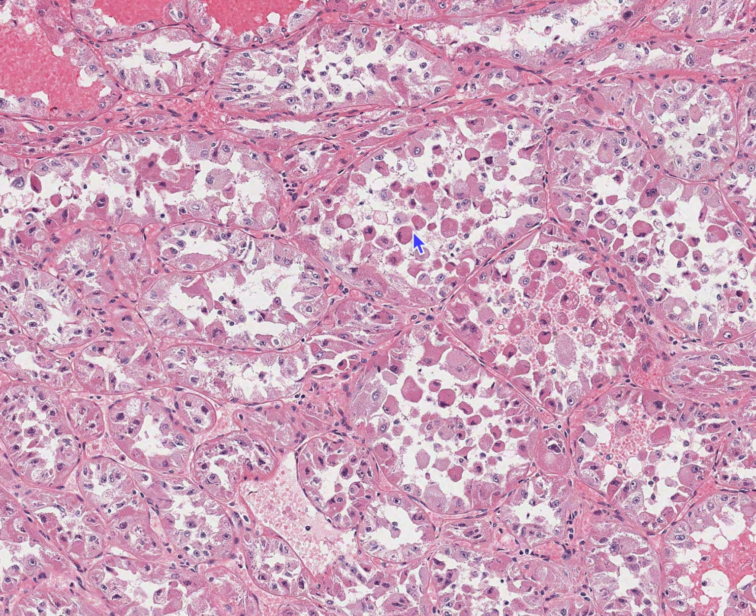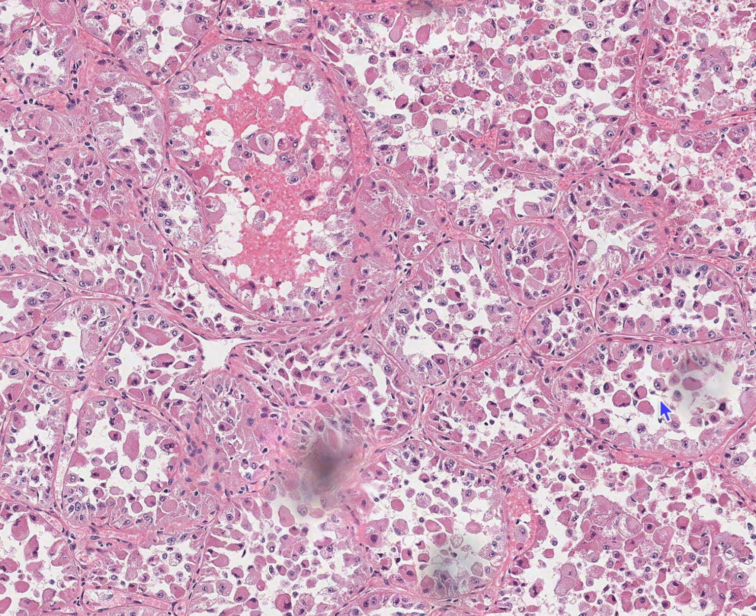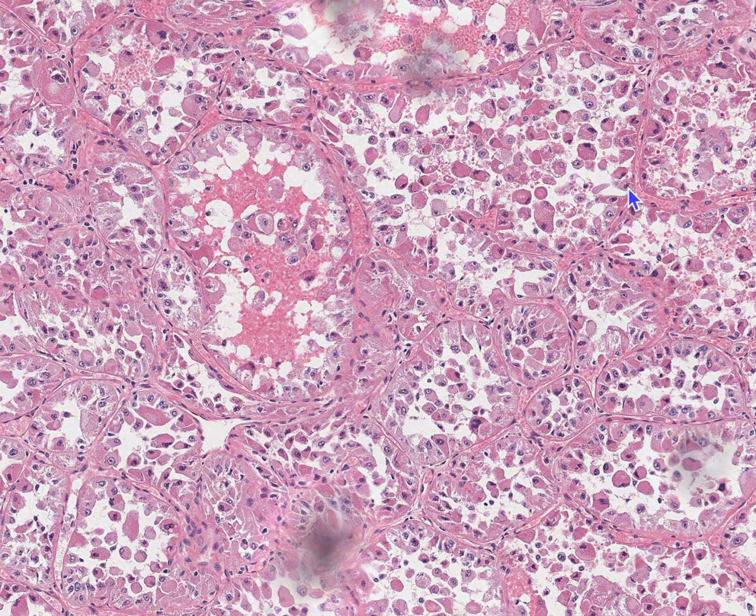We see eosinophilic cytoplasm, and sometimes you'll have these cytoplasmic vacuoles. I don't see really good ones here. But in addition, you will have prominent nucleoli. You could see that from afar, but as we zoom in closer, you can see a lot of these have prominent nucleoli.